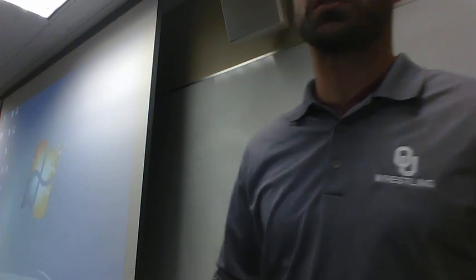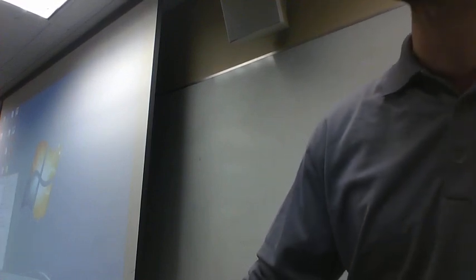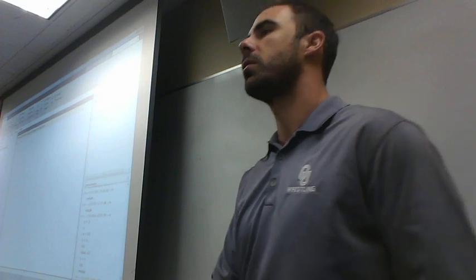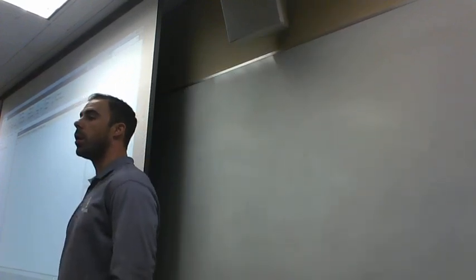So one way we can do that is we can come down here basically to our start button. We'll see MATLAB come up. One handy trick is to put it right down here, make it a desktop icon. It brings up MATLAB like this. Are we still loading the data set from last week? We're not going to load that one right now, but that's going to be the next thing that we do.